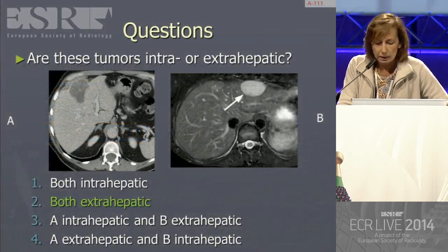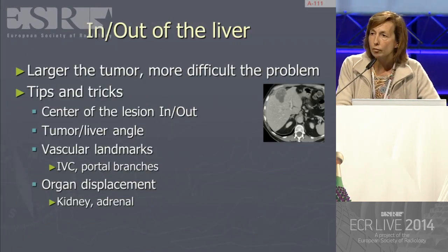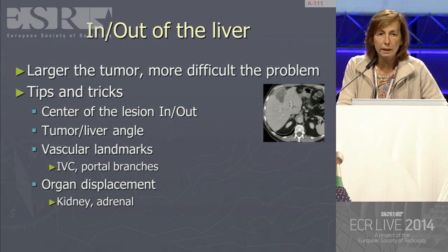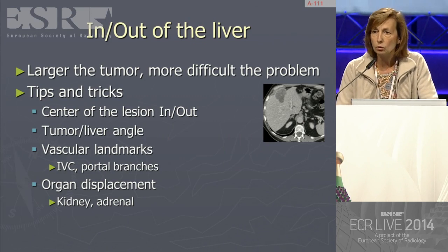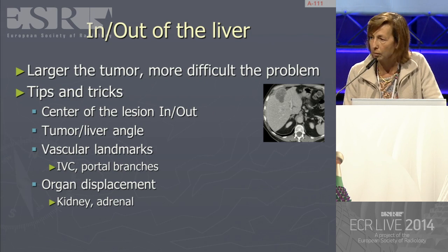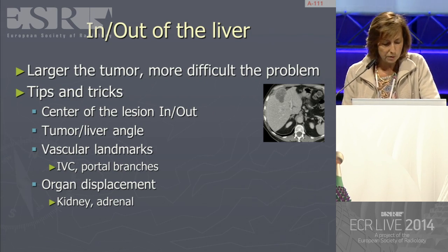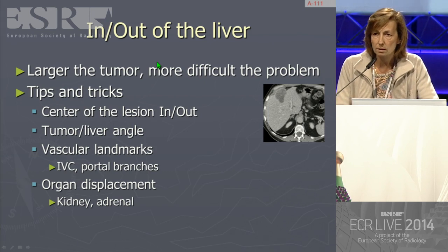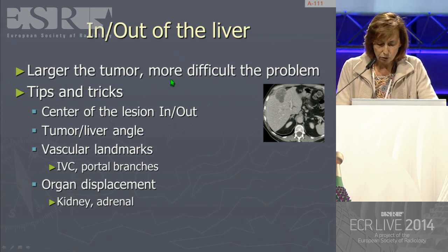This is a very difficult topic, and we often face this difficult situation, whether a tumor is intrahepatic or extrahepatic. And one rule is, larger the tumor, more difficult the problem. Let me give you some tips and tricks. First of all, try to look and to assess the tumor center.